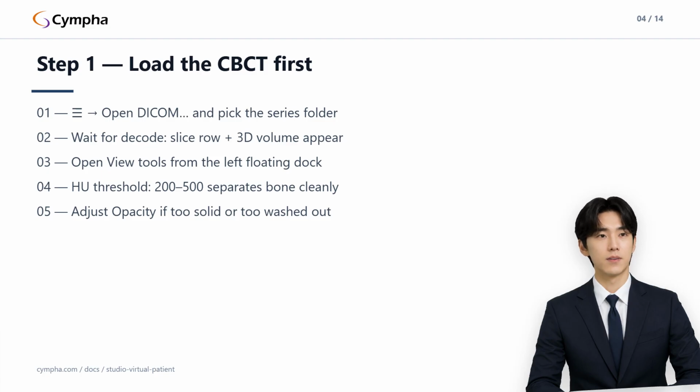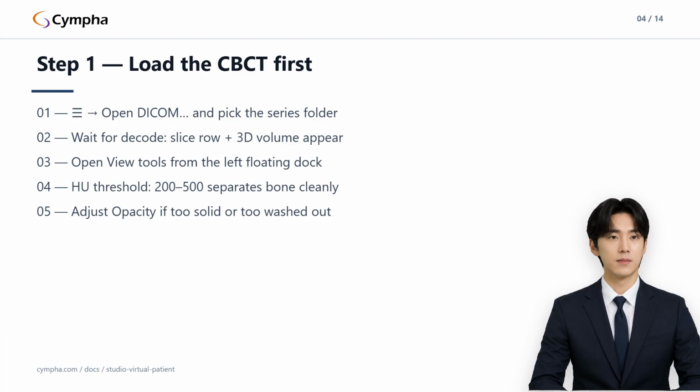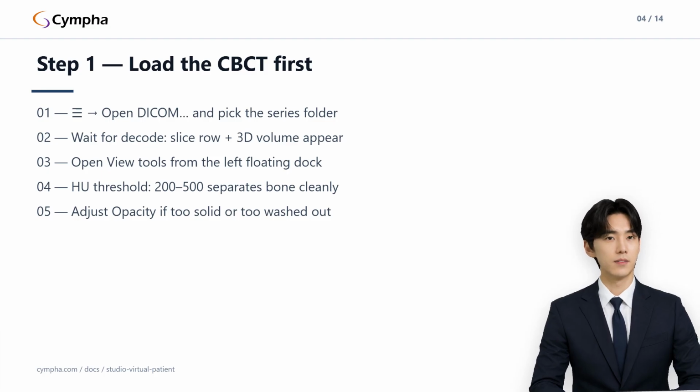Keep this picture in your head for the rest of the lecture. The volume sits at the center, and everything else, arches, face, photos, joins it, never the other way around. Two side notes before we move on. If implant plans are stored in your Cympha cloud for this particular CT series, Studio may offer to import one right after the DICOM finishes loading. You're not doing implant work today, so dismiss it and continue. It will offer again next time.